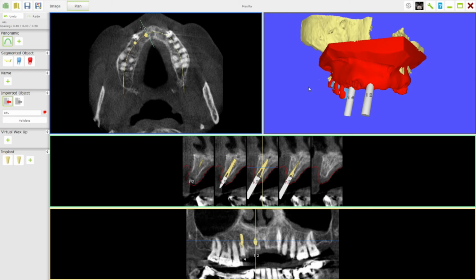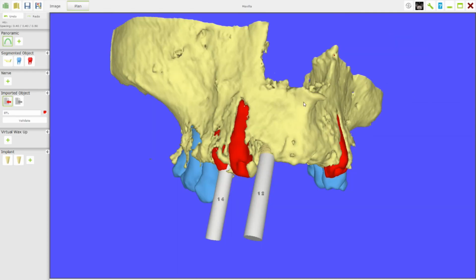Now, some of you may be thinking, well, why not position the second implant in the canine socket? Well, I personally prefer a more even distribution of the implants for support, but also if I click out the models now, you will see that when I take the models out and we zoom in on that screen, can you see how fine the bone is covering the buccal root of the canine?